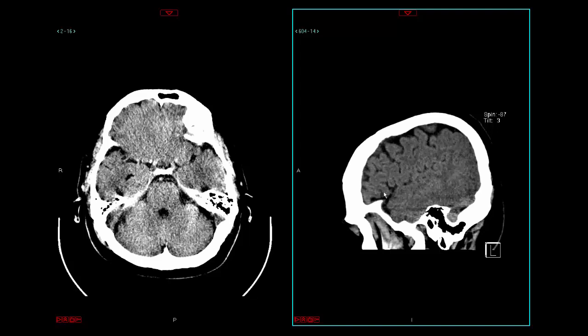As far as the frontal lobe, the inferior frontal gyrus is concerned, once again, we're probably seeing portions of that operculum sitting here, with three pieces to that. The pars orbitalis, which would sit here, the pars triangularis, which would sit here, and the pars opercularis, which probably sits right about there. But those are pieces of the inferior frontal gyrus that are going to overlie the insular cortex along the anterior margin of that.